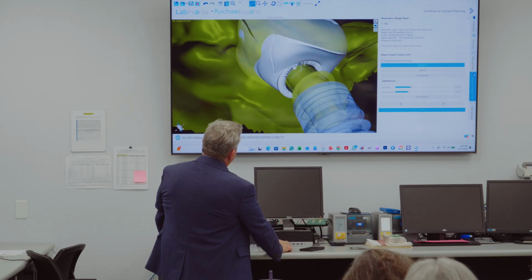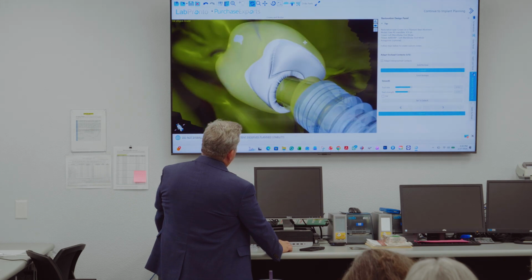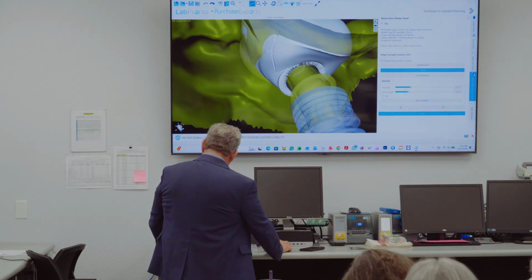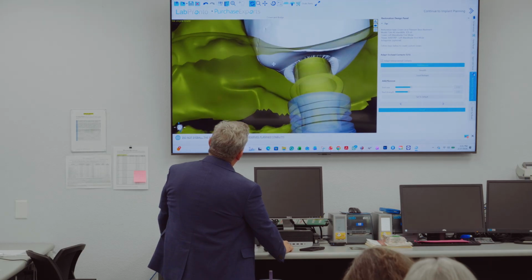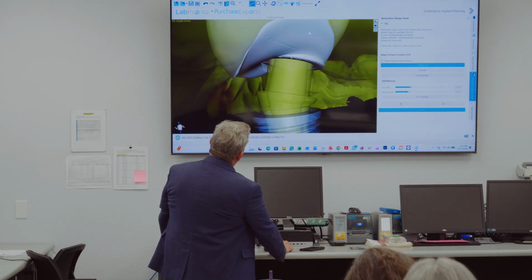Or say they don't like this right here. This is taking the triangles, it's kind of distorting them. I can still smooth these out, but be careful because it takes some of those triangles and messes with them. Okay, so I don't like that. I can go back here. Wonder if I can add to that. No, I did that. I have a weird contour there, and over here too.